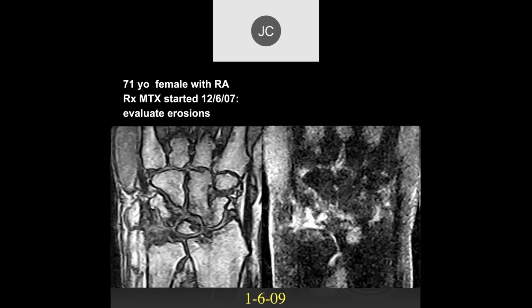So now the osteitis is basically markedly decreased, maybe a little bit in the distal radius, but now we have bone fusion. And these fusions are very common with rheumatoid arthritis, and I think what happens is if you get osteitis on two sides of a joint, that osteitis will affect the subchondral bone, and just like we saw in the metatarsophalangeal joints, will cause the articular cartilage to disintegrate, and then you'll have inflamed bone against inflamed bone.